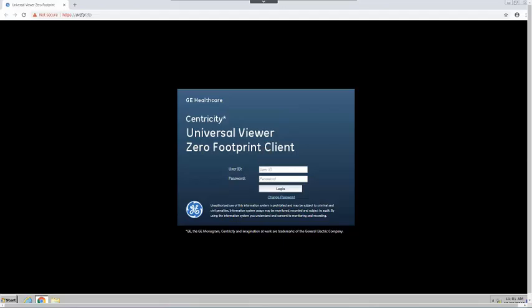Welcome to the Centricity Universal Viewer Zero Footprint Client. In this video, we will discuss logging in and searching for a study or a patient. To log into ZFP Client, open the URL and enter the user ID and password credentials.